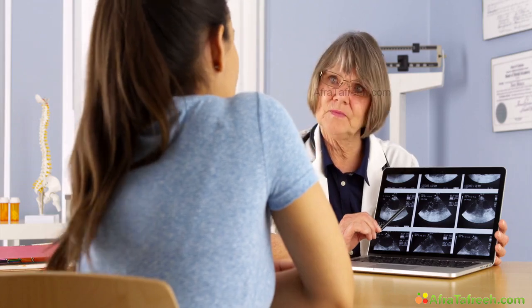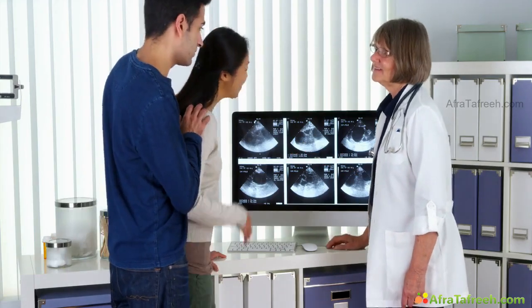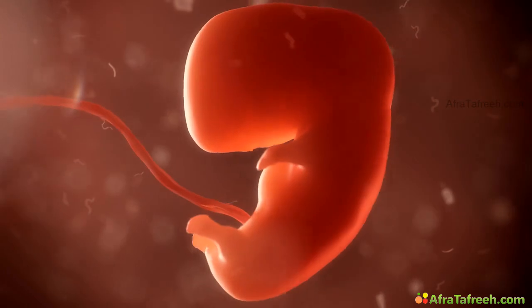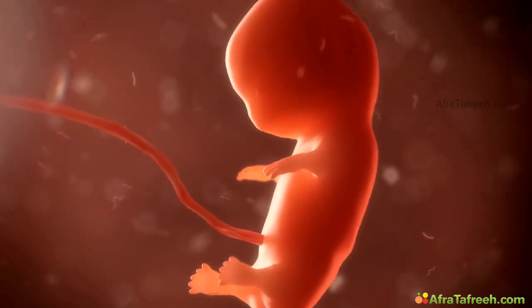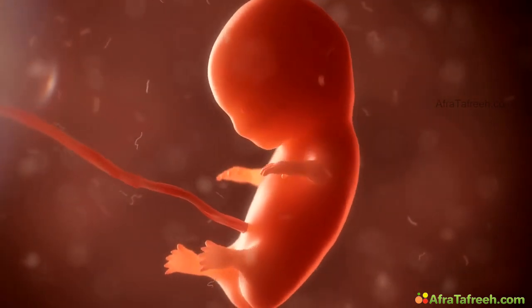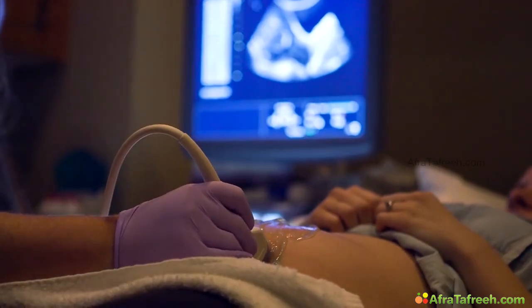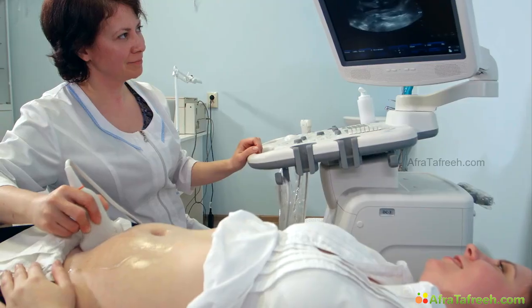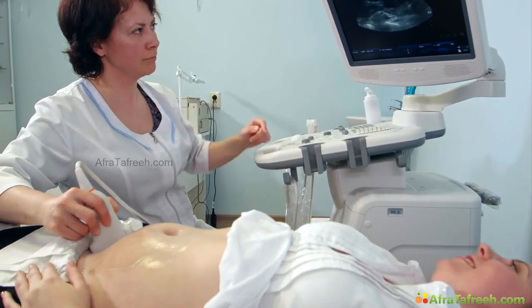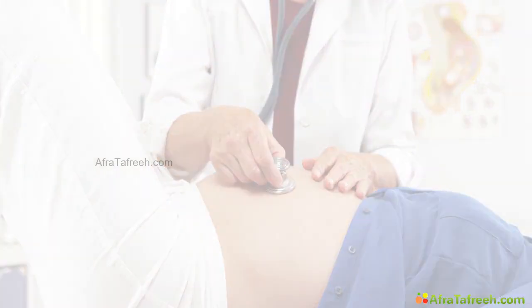When a woman presents herself with acute pain and/or unexpected blood loss, it's extremely valuable to confirm or exclude early and ectopic pregnancy, missed abortion, multiple gestation, molar pregnancy, or other high-risk factors. Some of these complications can be detected quite early with primary care ultrasound. In primary care obstetrics, ultrasound has a very important role in complementing physical exams and urinary tests.